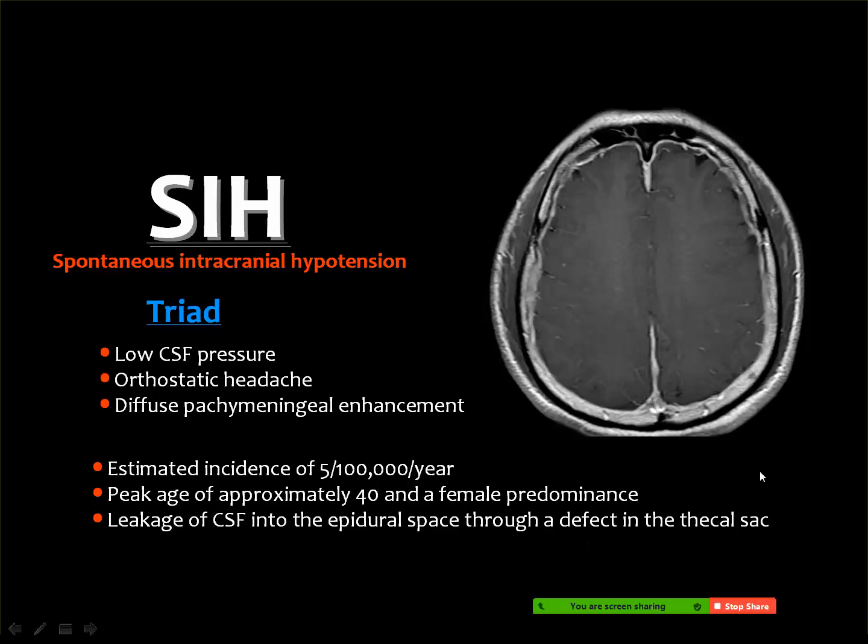Then this is a triad of low CSF pressure, orthostatic headache, and a diffuse pachymeningeal enhancement. There is diffuse meningeal enhancement and thickening.